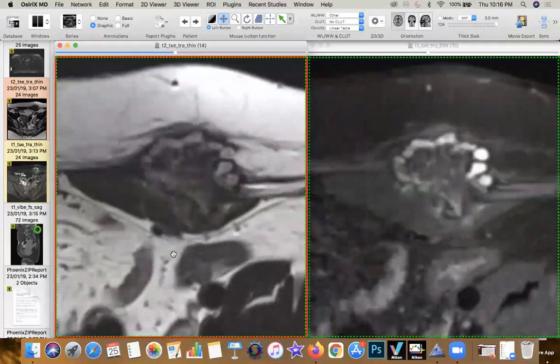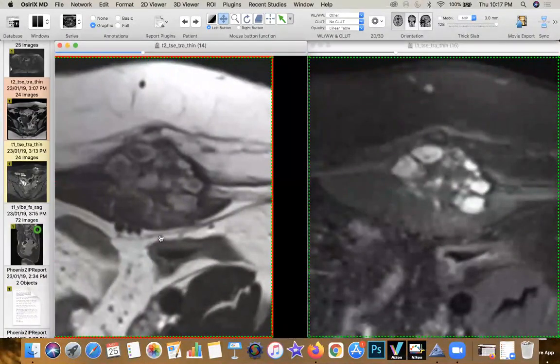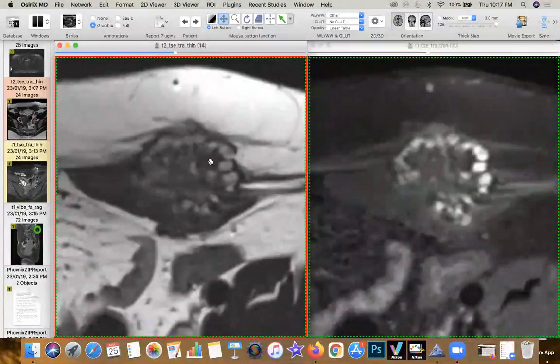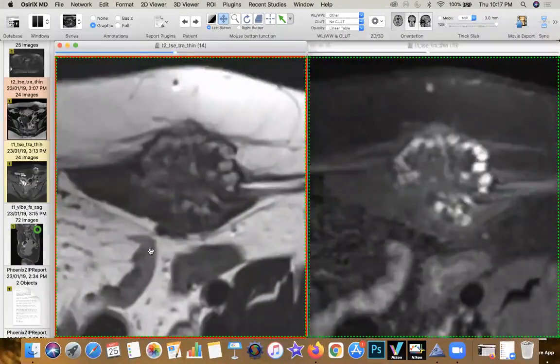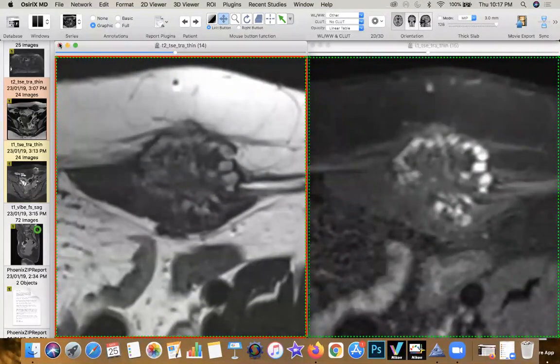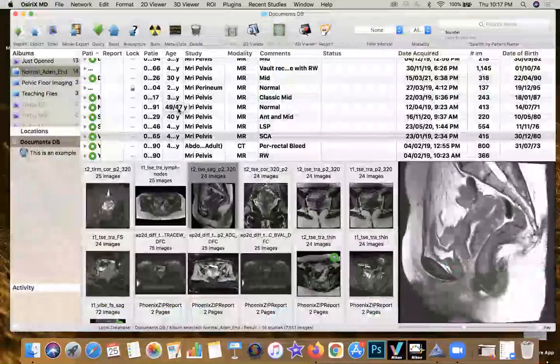And you also note that there is a thin twig which is extending from this puckered peritoneal reflection into the bowel loops. So you not only have scar endometriosis in the anterior parietes, you have the scar endometriosis infiltrating the properitoneal fat, infiltrating the parietal peritoneal reflection, and also tethering a small bowel loop at this location. So please remember that whenever you have surgical planes in relation to the uterus, it's pertinent for you to identify all these surgical planes and make sure there's no evidence of disease at any other site.